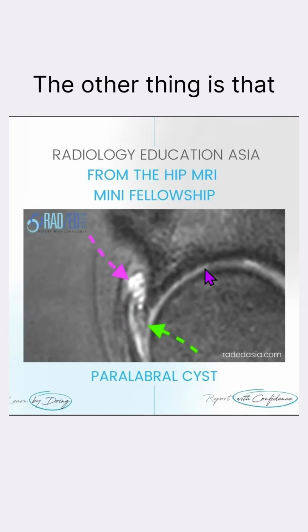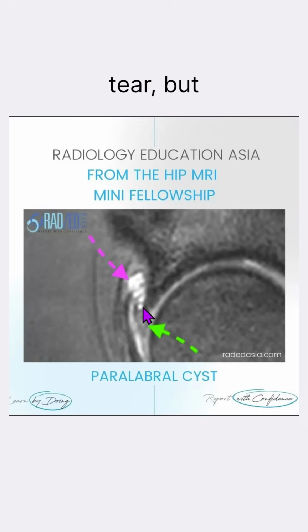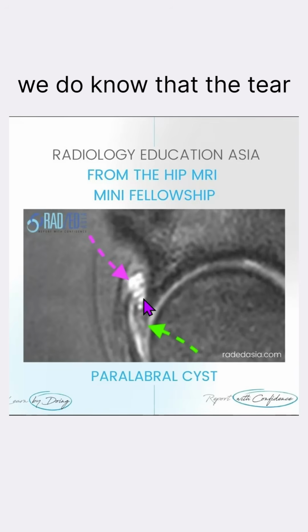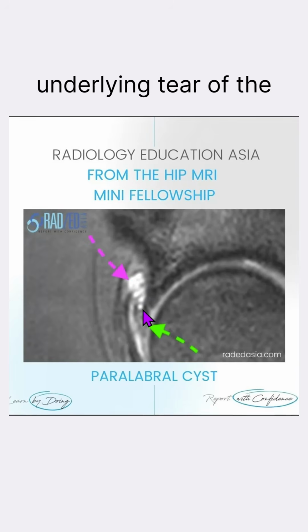The other thing is that you may not actually see the underlying labral tear. So in this case, we don't really see the tear, but we do know that the tear has to be present. So if there is a paralabral cyst present, there will be an underlying tear of the labrum.